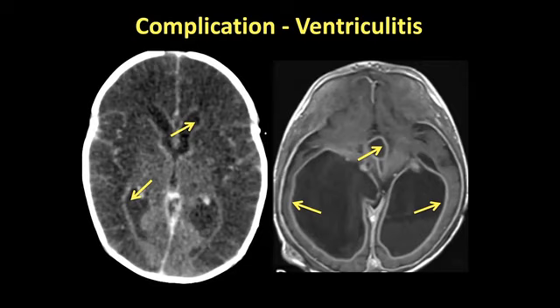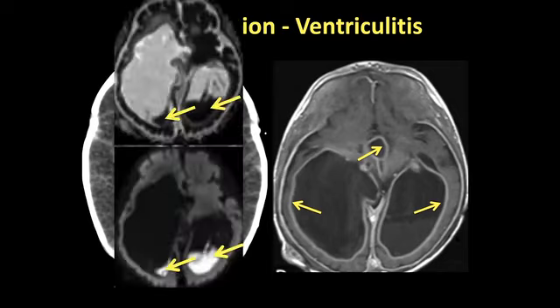So what is one of the other signs we need to look for? It may not be that clear when one looks at the ventricles on CT or MRI. But if one does a DWI sequence, you will be able to see the thick proteinaceous fluid layering posteriorly in the ventricles in this patient. Again, thick infected proteinaceous material in the dependent parts, which is better seen on MRI.